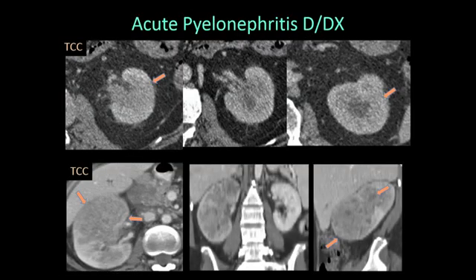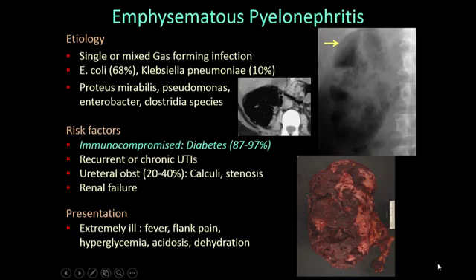Also, if you are seeing these patients in the emergency room, many of them come very similarly with hematuria and maybe even flank pain and fever, but you want to make sure that you evaluate these patients for follow-up. You can see that this may look like pyelonephritis to you, but this actually is a patient with transitional cell carcinoma. Both these patients can mimic pyelonephritis on imaging.